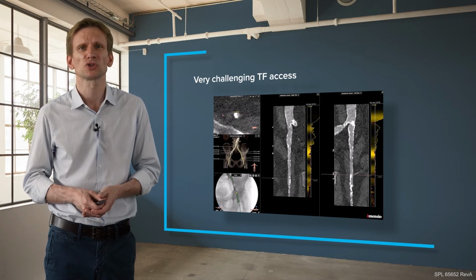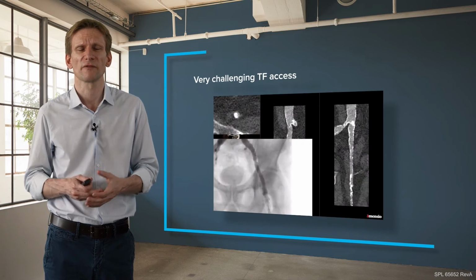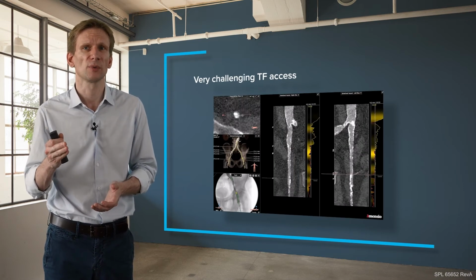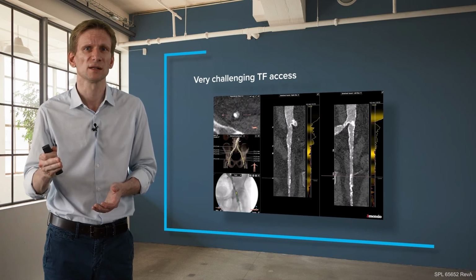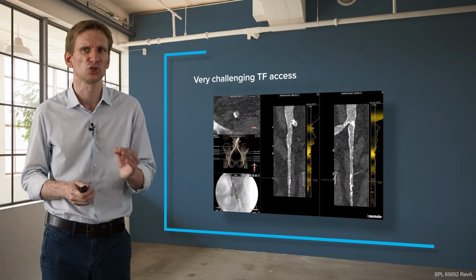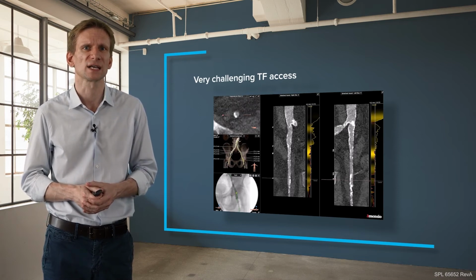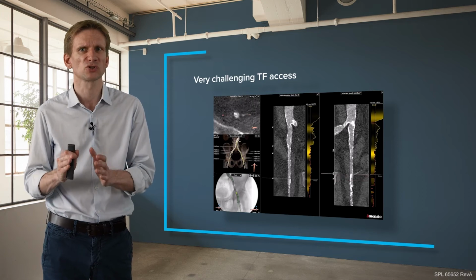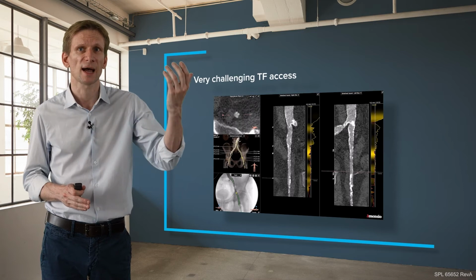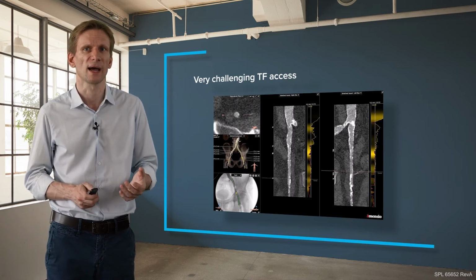So this is, of course, why I call it a very challenging transfemoral access. We have been thoroughly discussing this case. You might come in trouble here with your closure of your vessel. So this is not suitable for IVL treatment here because it's just a few millimeters above your puncture site. So this is not for IVL. I'm concerned for my access site, but I'm not concerned about higher up for the common iliac. There I'm sure I will have a good result with my IVL treatment.